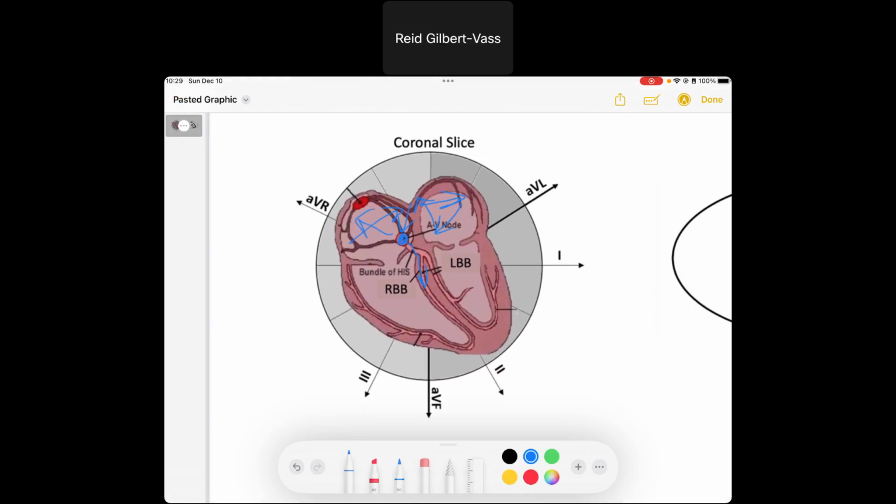And then these fibrillatory waves continue, and then they bump into the AV node and they send the signal down. And if you're young and healthy, then you can have AFib with RVR, where the ventricular rate is increased, just like we see in this individual.